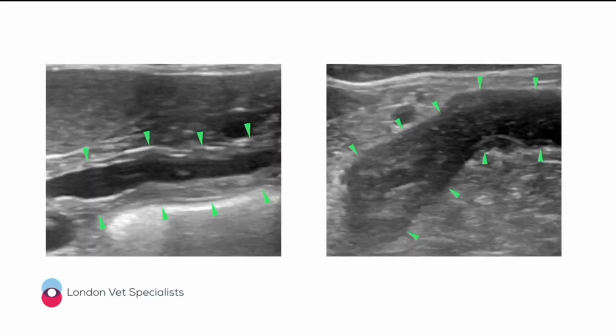Another word of caution when looking at the left lobe of the pancreas in cats. The size of the pancreatic duct can increase in elderly cats. So the image on the left here is a long axis image of a normal left pancreatic lobe from an older cat. And hopefully you guys can appreciate just how giant this pancreatic duct is. Now, a big pancreatic duct in an old cat is simply an incidental age variant. It's not a symptom associated with any sort of pancreatic disease, and it's certainly not a reason to be diagnosing that cat with pancreatitis. A big pancreatic duct in an elderly cat is nothing at all to worry about.